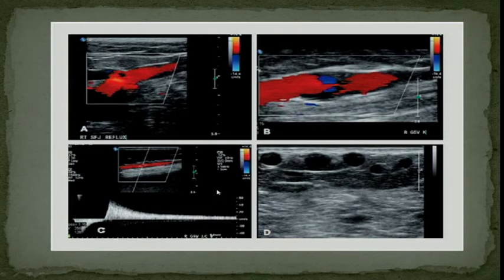Yes, Hunter? Yes, ma'am. So when you see a very backwards looking color pattern, like our first example there, it's all red and it should all be blue. How do you know that it may not be something with the tech, that they've done the calibration wrong and it's backwards or something? Look at this image here. Red on top, blue on the bottom. Apples grow on top, water is in the ocean. This is the normal color bar orientation.